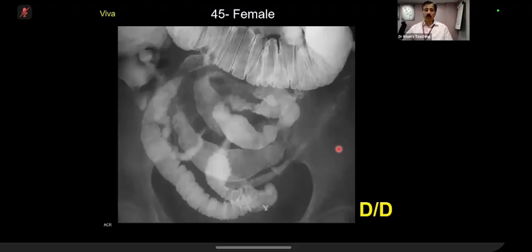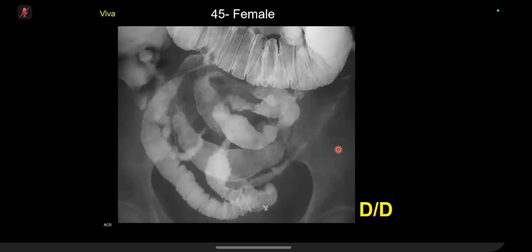Candidate 12, do you think that these are malignant strictures or benign strictures? Appearance-wise, I mean to say. So the bowel loops appear featureless, and I can see multiple strictures, and at a few points they're quite long strictures and they're irregular. I can't see any typical shouldering in them. So I'm thinking that as there is a history of radiation, this is likely radiation-induced strictures.